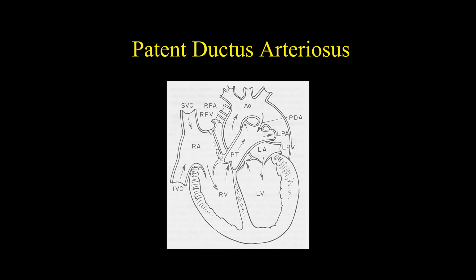So now let's look at the rest of the heart. So up in here is the right atrium. So it's a thin-walled chamber, and it accepts blood from the cranial vena cava and the caudal vena cava coming from the head end and the tail end of the dog. So it comes in here, dumps into the right atrium. Okay, then it sits in the right atrium for no time at all and gets swept away into the right ventricle. Okay, and it goes through these valve leaflets right in here, and those valve leaflets are called the tricuspid valves. Okay, once it goes into the right ventricle, pretty soon this right ventricular wall will contract and it pumps the blood through the pulmonic valves into the main pulmonary trunk, okay, the pulmonary artery.